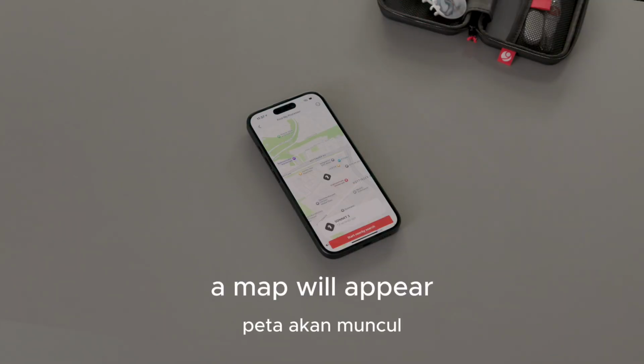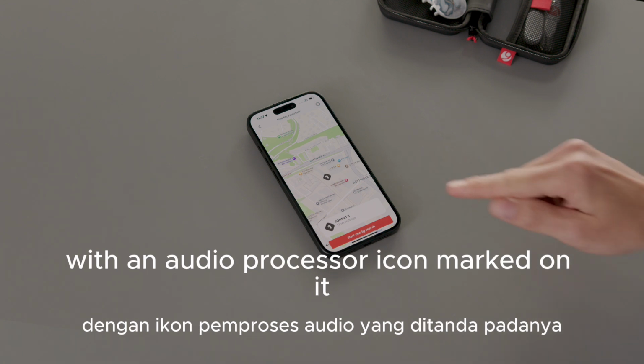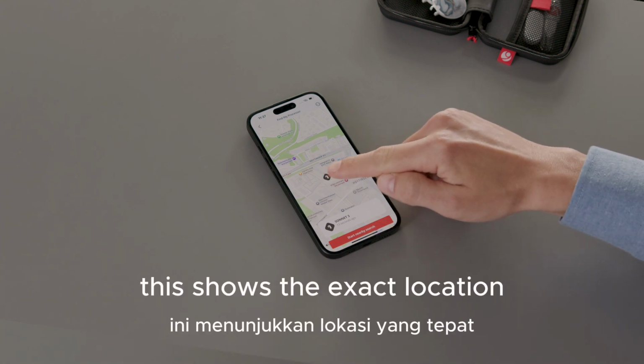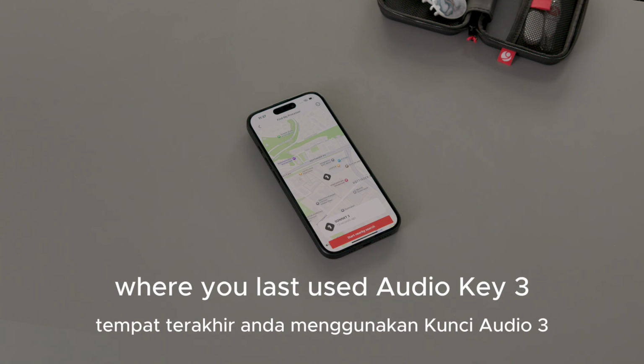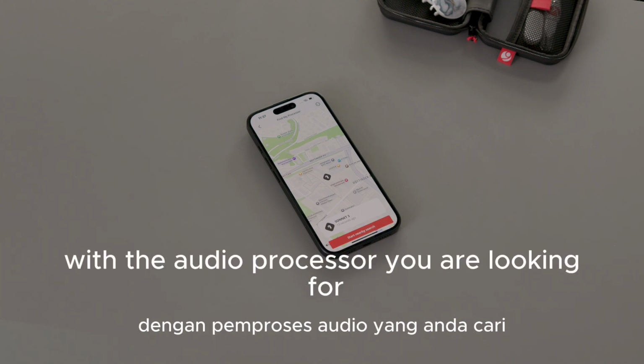A map will appear with an audio processor icon marked on it. This shows the exact location where you last used AUDIOKEY 3 with the audio processor you are looking for.